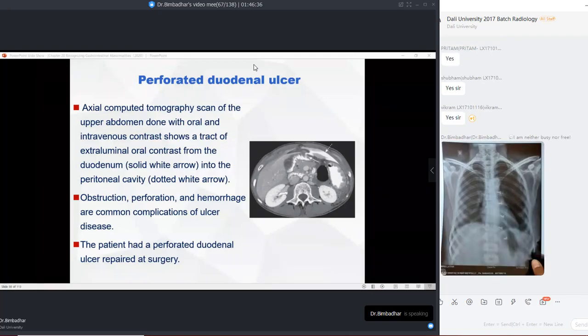Okay, the brain CT and the brain MRI showed no abnormality related to any cerebrovascular deficit or any kind of brain lesions. EEG appears to be quite normal. And then the patient also complains of respiratory distress, so that's the reason a chest X-ray has been taken. Now you have to analyze this condition and tell me what could explain all the things: the patient presenting with seizures and also respiratory distress, chest pains and all other things. Right now you have to explain all of them just based on this X-ray.